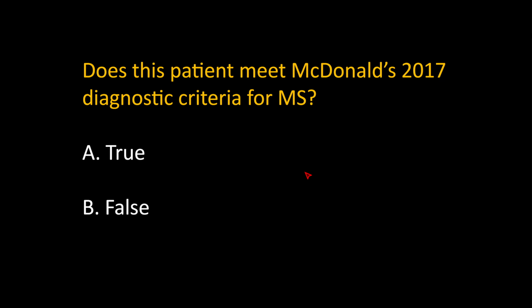Now the question is, does this patient meet the McDonald 2017 diagnostic criteria for multiple sclerosis? And the answer is true. This patient now, regardless of what any lumbar puncture or any other studies show, meets the McDonald 2017 diagnostic criteria for MS, provided that a limited mimic workup is excluded. So for instance, things like checking for Lyme disease and so on, a lot of lab work basically.